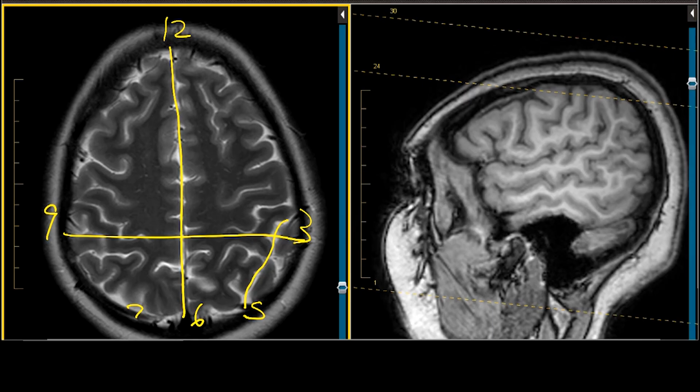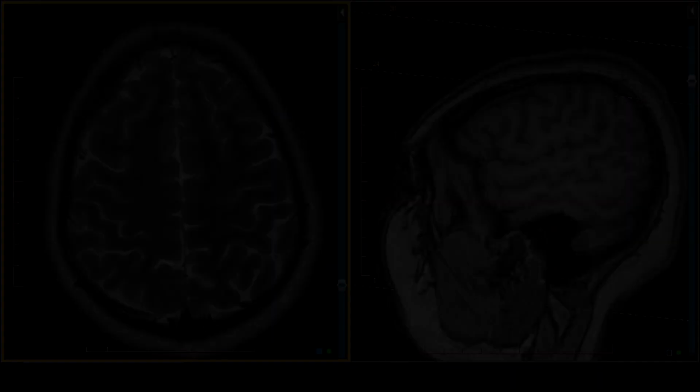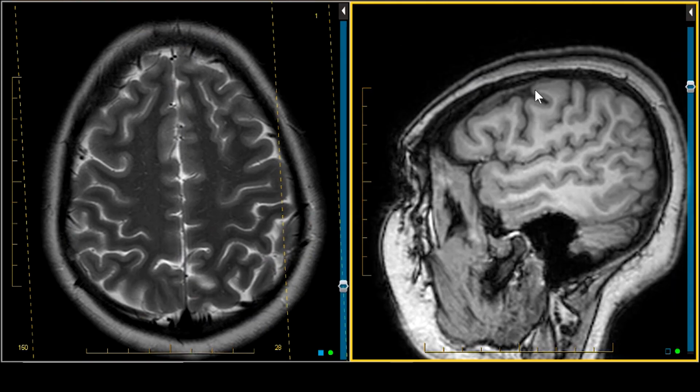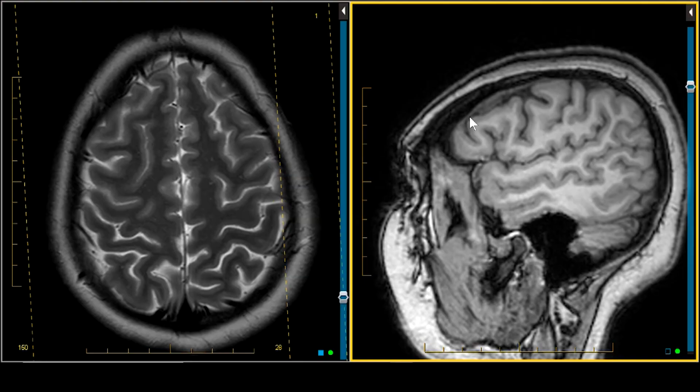Now, another way to go at this is to look at the sagittal projection. Here's the operculum, and right in the back is the staircase descending: precentral sulcus, precentral gyrus, central sulcus of Rolando. Let's tap that. Cross-reference it. Now you've got your central sulcus. If you've got your central sulcus, easy.